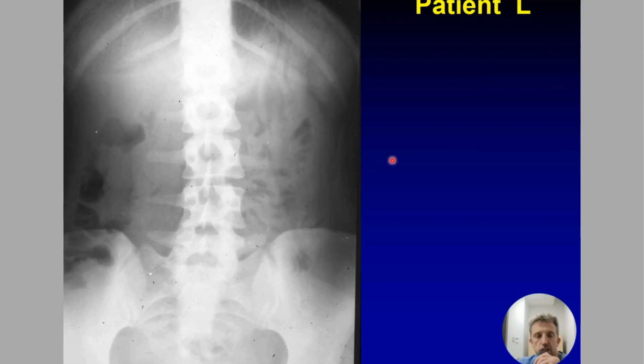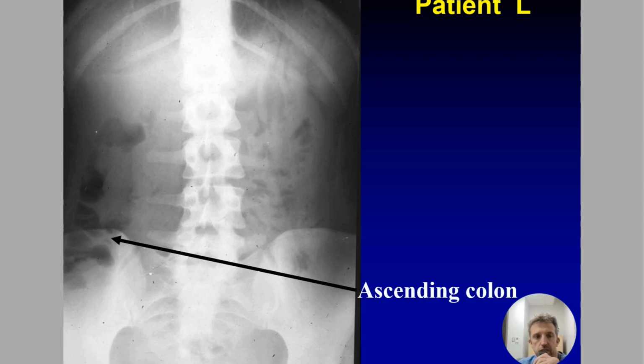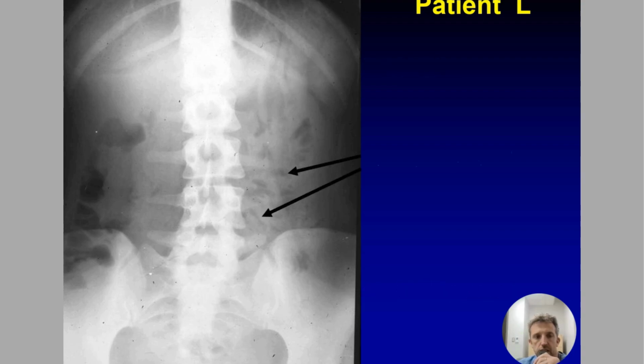Okay, so let's start with this radiograph. Stones, bones, mass, and gas. I don't see any lines or tubes. Bones look okay. No mass or mass effect. And bowel gas, we have the colon on the outside, small bowel on the inside, a little bit of distal gas. This is normal. And free air, is there free air? Well, we have to know how to look for free air first. So let's learn. There's our ascending colon, stomach.